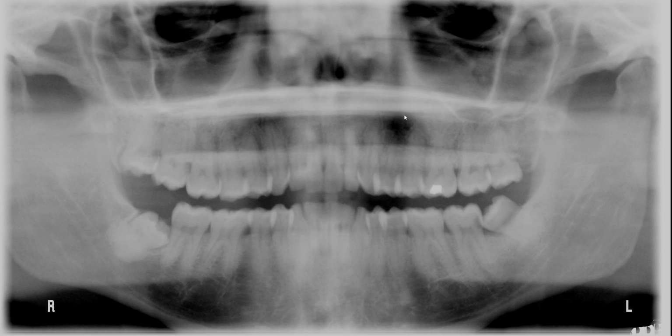Before I finish, another thing that I can point out is that below the roots of these molars, you're going to see a relatively straight radio-opaque line. And you may be wondering what that is, or perhaps you never noticed that because your eyes just got accustomed to seeing that, right? Sometimes you don't always nitpick and figure out what each of these landmarks represent. So this is actually a ghost image of the mandible. This whole area, you're looking at the inferior border of this mandible, and that is the ghost image of the opposite mandible, okay, the left side.